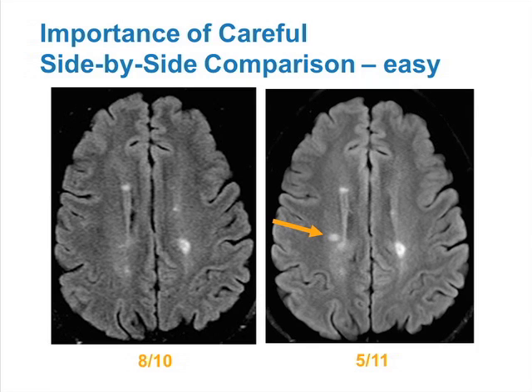Now, the goals of follow-up imaging in multiple sclerosis, as stated earlier, are to see are there new lesions and would there be any larger lesions. To do that, it's important to put side by side the slices from an earlier image to a new image and then to evaluate that. If you don't line them up carefully, you will be comparing apples to oranges and you may be faked out by new lesions that are not actually there.